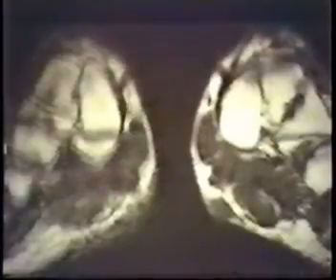It's just a little makeup container thing that's made out of plastic that we put peanut oil in. And it's very helpful in doing imaging. You just tape it onto the body in the area of interest, and then you know where to look. This is a patient who had a very interesting, again, doesn't look like much on the first echo, bright on the second echo, got to get worried. Here you can see fluid along the tendons, and this is pigmented villonodular synovitis of the tendons. And let me just, there's one other case I want to show.